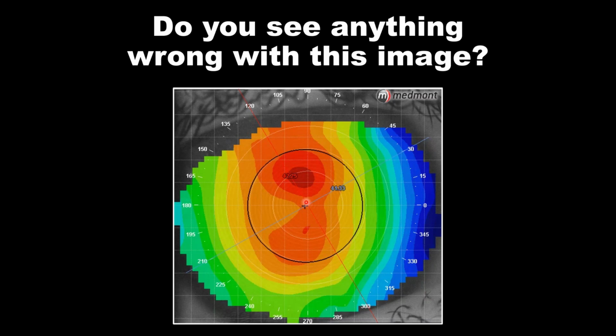But looking north, you notice that the lid and eyelashes are limiting some of the coverage of the superior topography. And this is a reminder for your orthokeratology, when you're wanting to construct a lens, a rigid contact lens, do a composite topography. Don't just do a single map. Then we would understand a little more of the data up here. The other consideration is maybe I just did a really bad job of selecting my topographies.